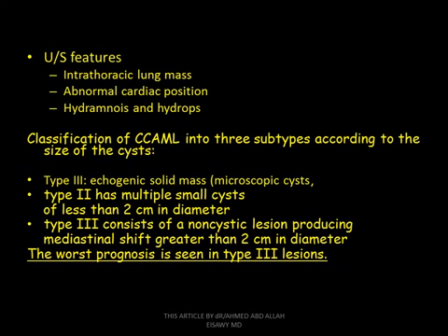Ultrasound features: intrathoracic lung mass, abnormal cardiac position, hydramnios, and hydrops.